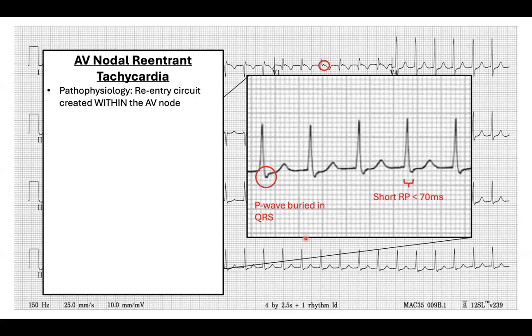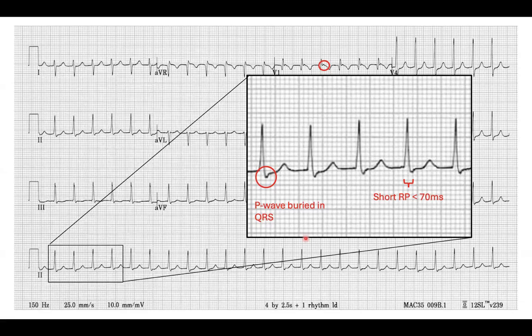Can I just emphasize one thing about these P waves? You mentioned lead 2 and V1, which are two of the best places to find P waves. But you may be watching this and say to yourself, okay, I saw that Emily pointed them out, but how can I do this by myself? Two things. One, it's very helpful to have a baseline ECG. For example, that little red circle in lead V1, that little hump she has highlighted. You can look at a baseline ECG, and that little notching at the end of the QRS when the patient's in sinus rhythm should not be there.